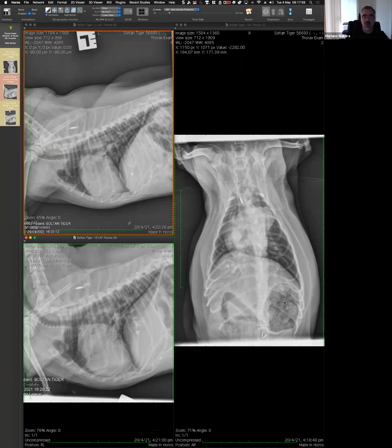So not even trying to figure out what is going on, but where. So if you have a dyspneic animal, you take a radiograph. Can you make the big call? Is it the lung that is severely affected? Is it the pleural space that is severely affected? Is there a huge mass in the mediastinum? Makes sense? So can you give me the first approach, the lesion localization?